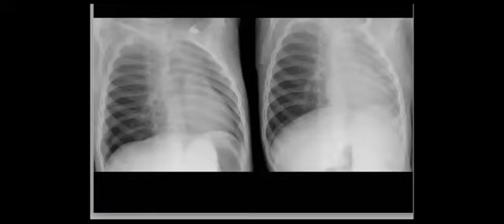They like to show you some foreign bodies in general in pediatrics. They like the foreign bodies, so be careful about it. So here there is a foreign body in the larynx, in the subglottic region. And this one they like to mention in the MCQ again and in the short questions.